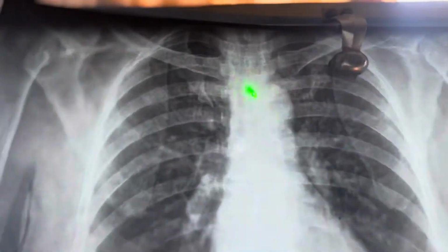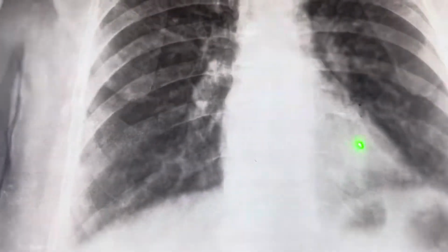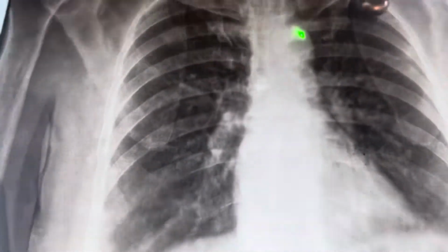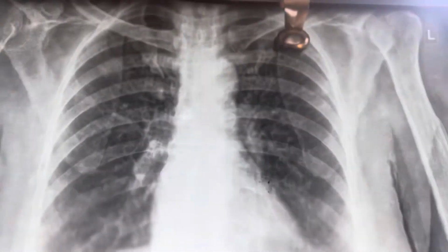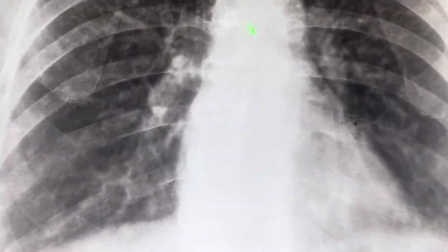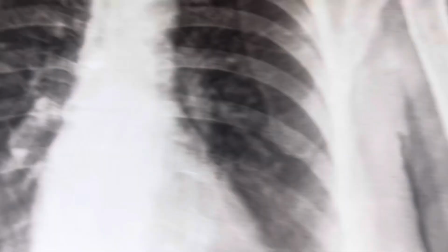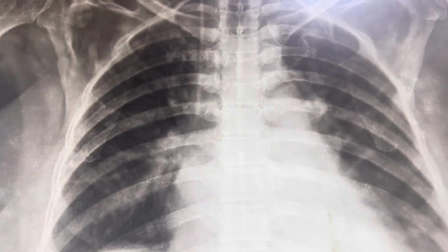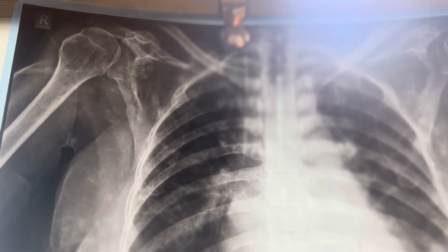Again, repeating the things: air in the trachea, mediastinum, the shadow of the heart, the left ventricle, the cardiac notch, the ribs, lung, aortic knuckle, cardiac notch. These are the parts that you should know for the chest x-ray, and also the hilar region, for the hilum of the lung. These white dots represent the hilum region. This is the anterior-posterior view. We can see the vertebral column in this, and this x-ray is taken from a patient in the supine position who was on the bed.